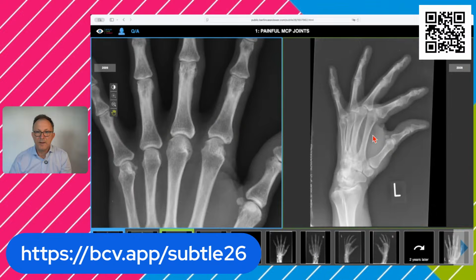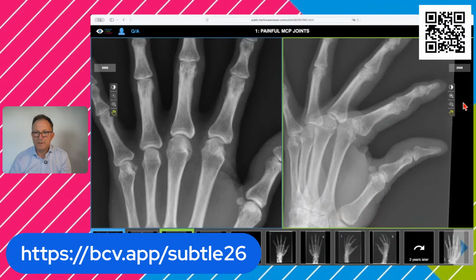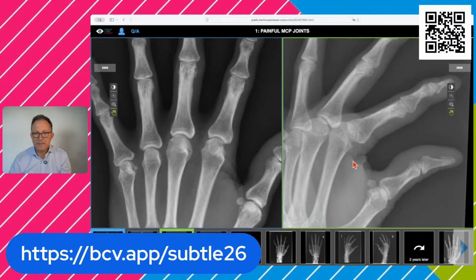And we can look at the oblique images, and if you do this, you will be surprised what you can see, because you see that this is the normal bony contour, but here we have a hole. That's a defect in the cortex. So there's no cortex here, but it should be there. So in fact, this is the evidence of an erosion.